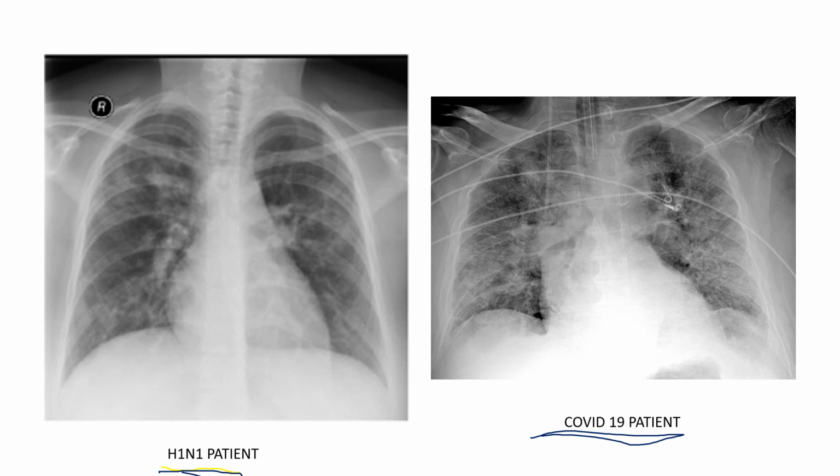Especially with virals, they tend to have, I call them fingers, but they tend to have, I hope you guys can all see this, streaky lines like spider webs. You guys see all these like spider web lines that are going through? And I hope you can. I really wish I had a better way of teaching this. So these streaky spiderweb signs, and they're all over the place, and they're more accentuated on the COVID-19 patient. When you're looking at these things, that's a big sign of a viral pneumonia that you're looking at.